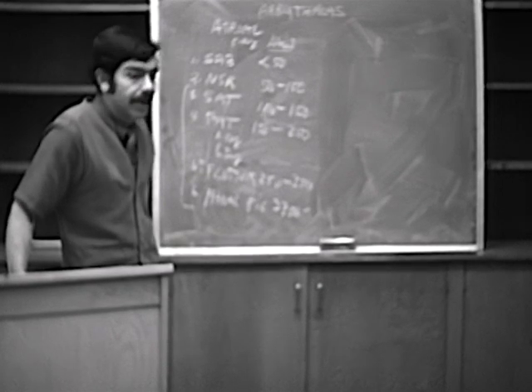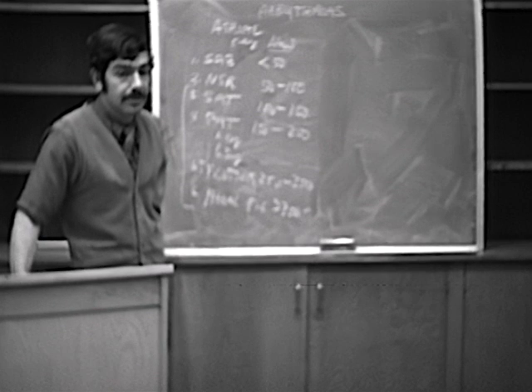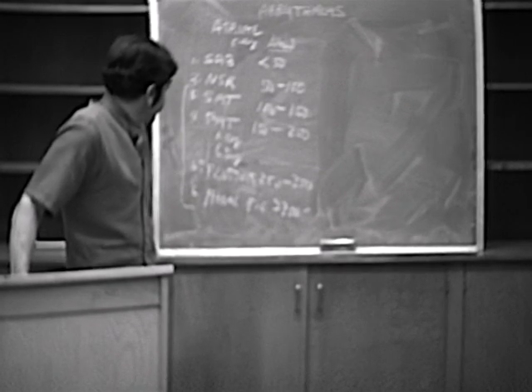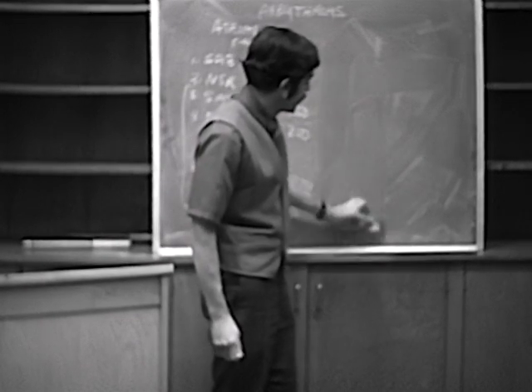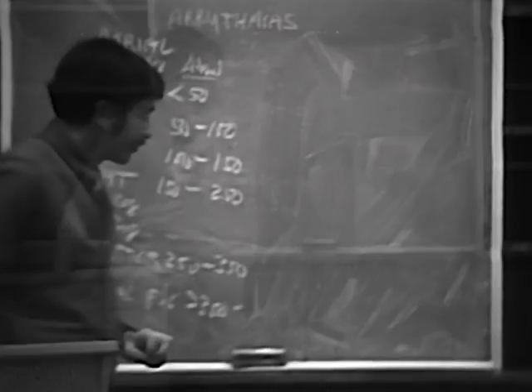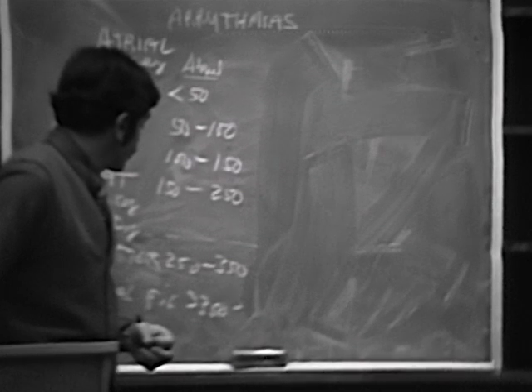And just looking at the monitor very frequently, or just a rhythm strip on the electrocardiogram, you cannot tell. You can't tell. So we could use the guidelines to help us in terms of rate if we can see the P waves, but it can be very difficult.